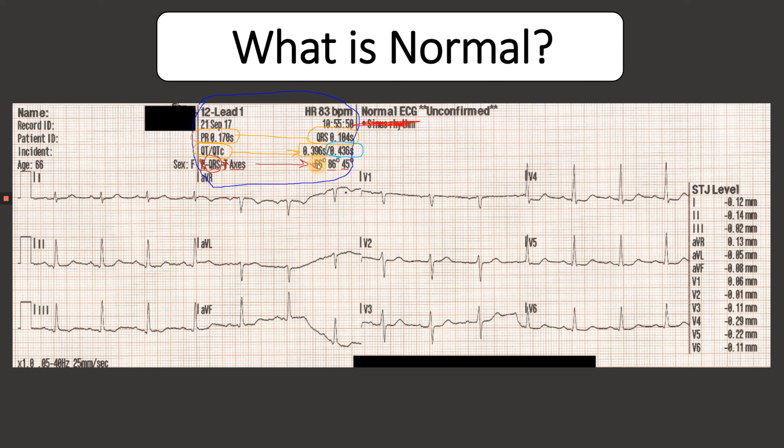So you can ignore this number, ignore this number, and just point all your attention to this number. When I ask you what the axis is, that is the number that I'm going to care about. We'll talk about what those numbers are in a later video, but that's where I'm bringing my focus. So that is the middle information presented on the 12 lead.